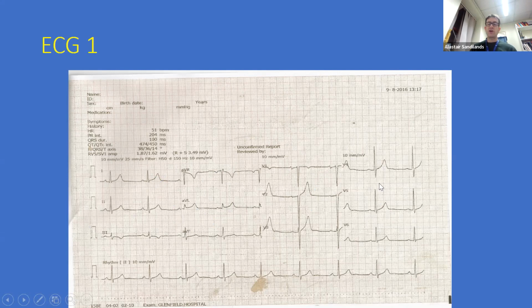And of course, you should have context of the patient. There's probably a little bit of what we call early repolarization here on this ECG, and so this would really be classed as normal. Of course, it helps to have context. If you said, look at this ECG, this patient hasn't had chest pain, then you wouldn't get worried. Your eyes might be drawn to this minor change. Certainly if it's someone with chest pain, then really you think about what the chest pain is like.